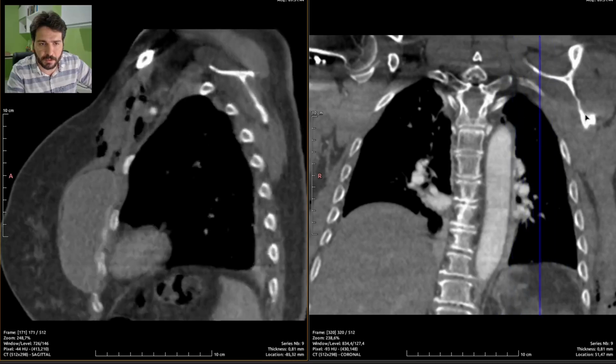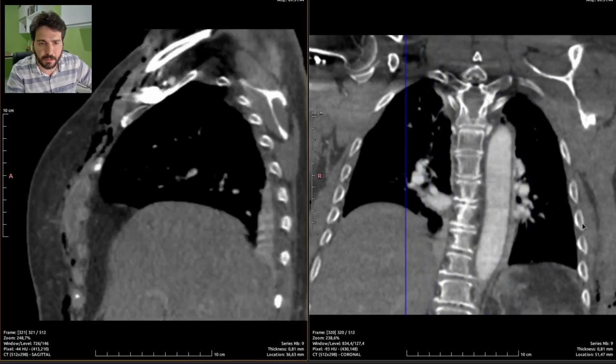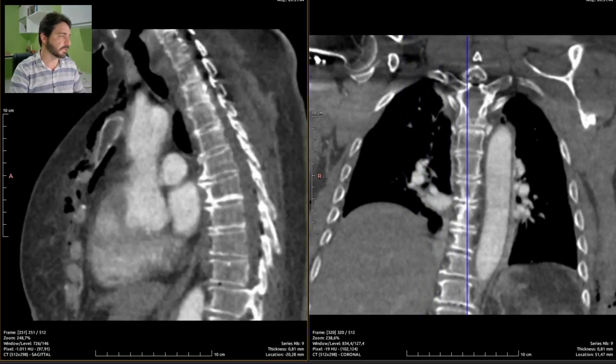There is no sign of such disease, and I'm convinced. Are you guys convinced? I am. Let's just get me a normal template for this exam, and this is it.